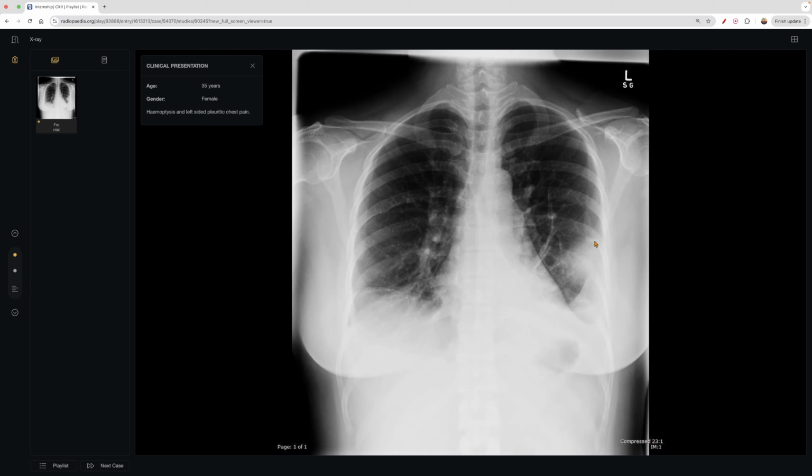It doesn't look like a little hazy smudge. It's not atelectasis, as we just saw, and then nodules or masses. It could be a mass potentially, but again, you're not really expected to see an air bronchogram. It's a little weird. And then as we come down, we see here potentially a pleural effusion, right? That costophrenic angle is rounded. We don't want to see it round. We want to see it sharp. And then same thing on this side. We come over here, it's not as sharp. You can see it, there might be something.